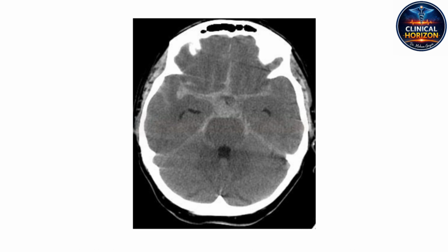This raises an important question regarding clinical workflow. The non-contrast CT is simply the alarm bell. It confirms the presence of subarachnoid blood, but it cannot map the vasculature. So you need a different scan. The immediate non-negotiable next step is a CT angiography, or ideally a digital subtraction angiography, to find the actual aneurysm.